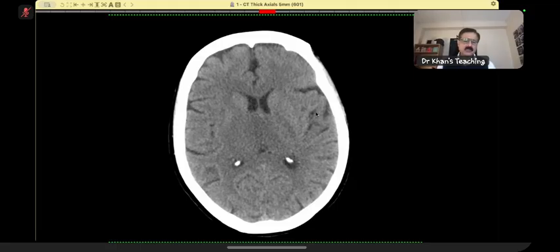What is gliomatosis? The anatomy is that the thalami are interconnected, the massa intermedia or whatever you want to call it, and the fissure. Gliomatosis, by definition, is a diffuse infiltrative tumor involving two or more lobes, some people say three lobes, which goes from right to left.